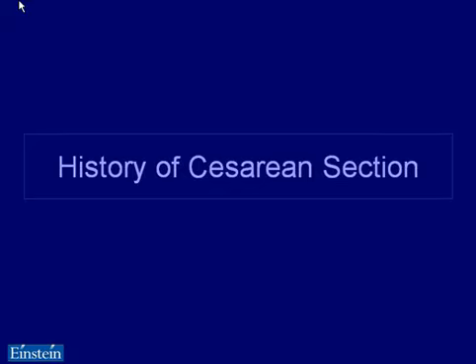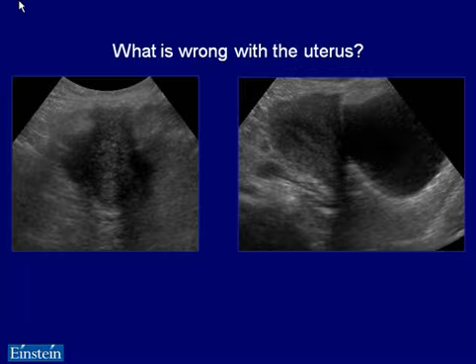And the kinds of problems that arise from this have made it one of the specific questions we ask patients before we begin imaging them. If you just ask if the patient's ever had any pelvic surgery, she may not feel that this is pelvic surgery and might not mention it. But knowing that there has been a cesarean section may lead one to image in a variety of different ways and expect certain things. So here's a typical patient who's had a cesarean section.